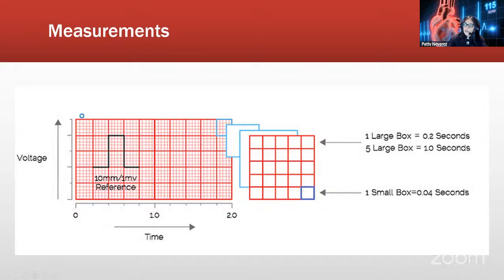We're going to call a large square this, and then the little tiny squares. So we're going to pull one of the large squares and pull it out. Let's just keep in mind this going across this, that's a large square. Anyone you pick around that, we're going to call that large square. Now, in a large square, we have 5 small squares horizontally, and we have 5 squares vertically.